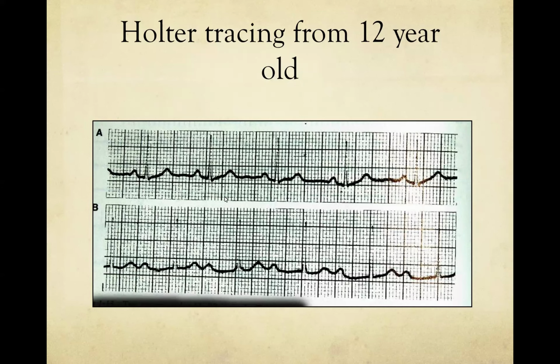If a patient was in the hospital, let's say for an appendectomy, and these tracings were picked up on telemetry, this is someone who I would at least have one follow-up with cardiology and perhaps repeat a Zio or a Holter to confirm that there's no higher grade AV block. Somebody who's doing this probably also has Mobitz 1 at different times. When the PR gets this long, it's not uncommon that that goes along with Mobitz 1 block as well. Any questions about that? Okay, forward.